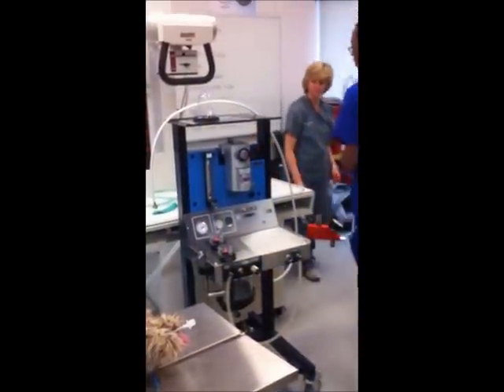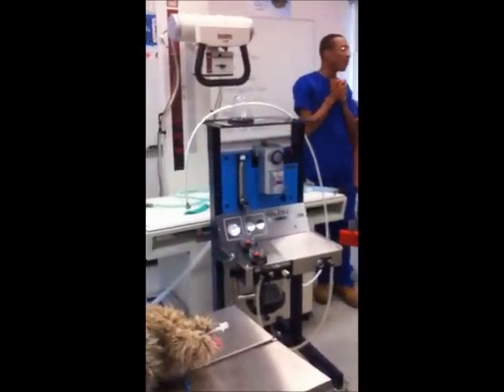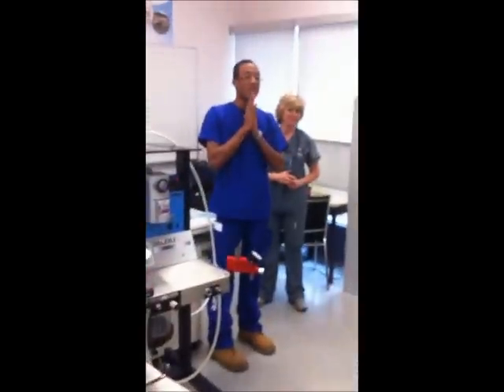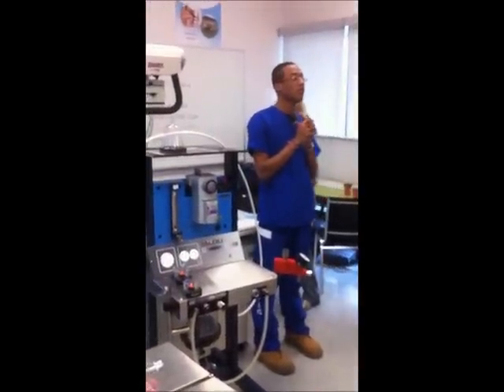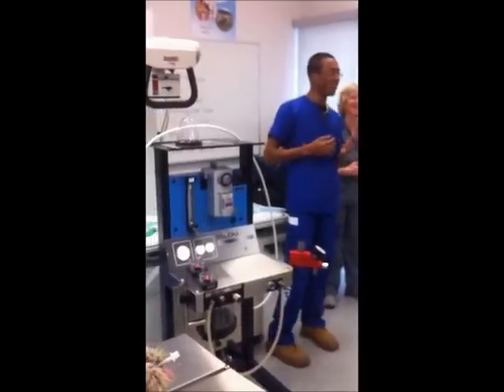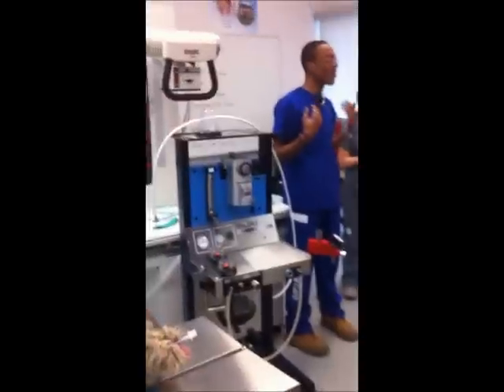Okay, so who's going to help us out in setting up the non-rebreathing system? Or do I get the joy of selecting someone? I did the other one. Technically, you did. It's okay. So, anyone? No? Do I have to pick? Okay, fine, I'll pick. I like picking. Jessica. Me? No, Sophia, I'm here. Pick someone else. I have no idea what you're doing. That's why we're here. We're learning.